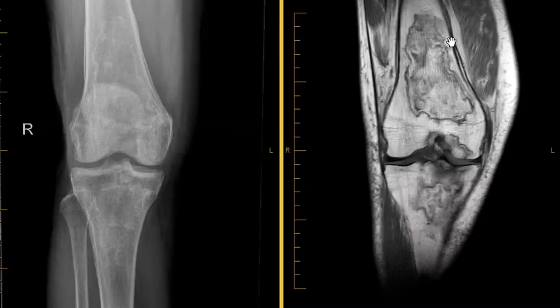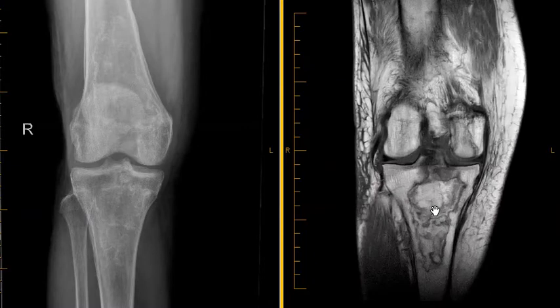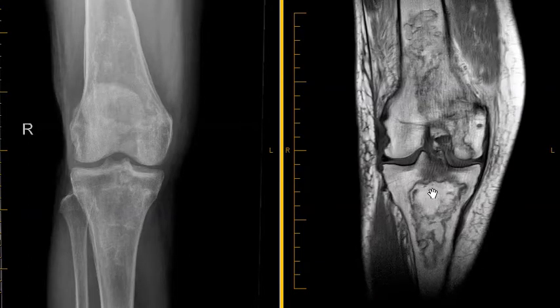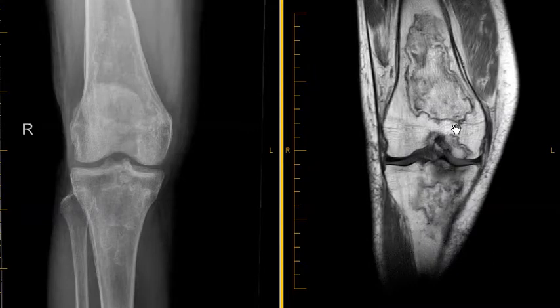And we see that the MRI shows this area of abnormal low signal around the periphery, and then centrally it has more bright signal similar to the marrow. This is the femur, this is the tibia, and now in the tibia is the same sort of process, this serpiginous, sharply defined band of low signal with fatty marrow in the middle and normal fatty marrow around the periphery. And this process does go into the medial femoral condyle. This is a classic case of osteonecrosis or avascular necrosis.